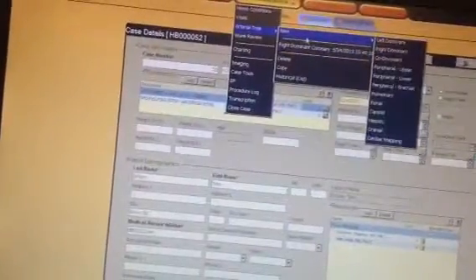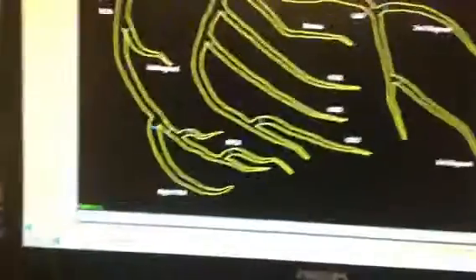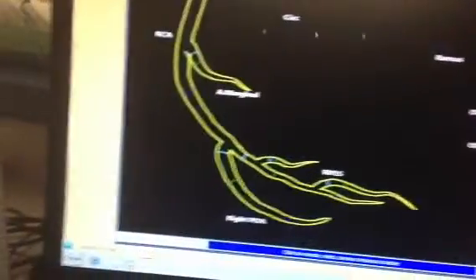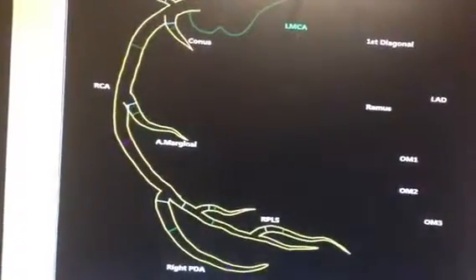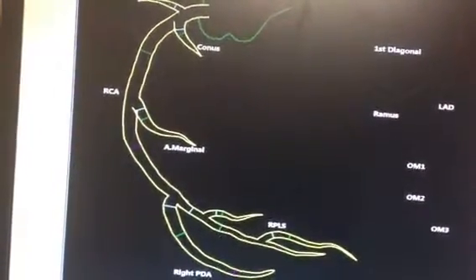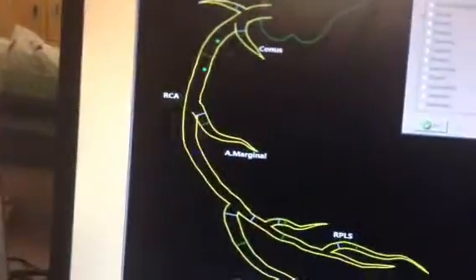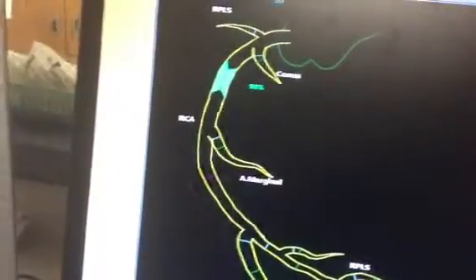So then, as normal, Dr. Lee will do her tree. Now she can finish on the tree that Dr. Schomer made, or actually make a new tree. If she makes a new tree, she'll want to delete everything else that she didn't look at, because she fixed on the right. She can delete everything over here, and that way it just shows what she fixed. She'll have to make the lesion here again, though. And we decided that was 90.